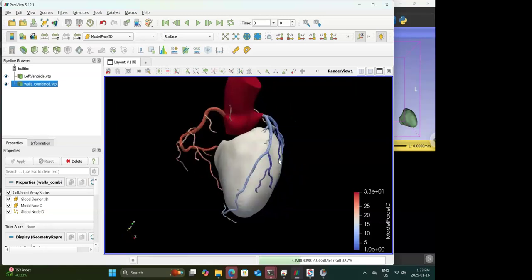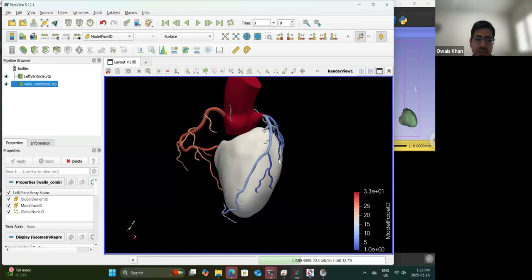Yeah, that was helpful. Just trying to see what to expect in terms of the pathlines and whatnot. Okay, thanks. Yeah, you can just Google coronary anatomy and you can see all of these different branches in a sketch. So once you start building up, you will see, you try to make the connection between what you're segmenting and what you're seeing on Google. You can Google any of the coronary anatomy, they'll tell you what the different branches are called.